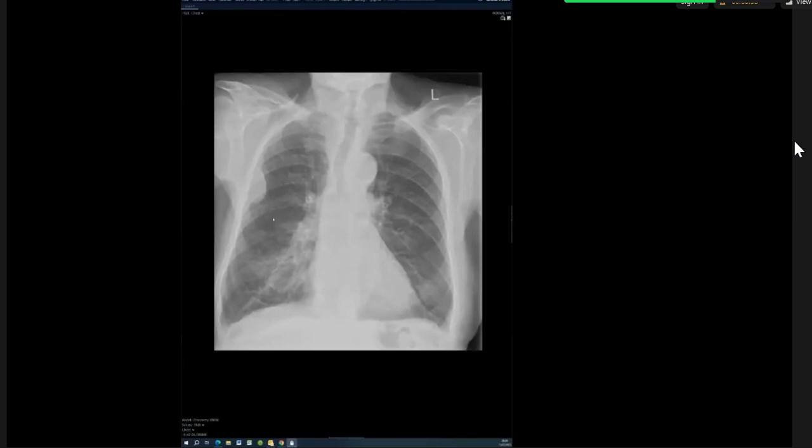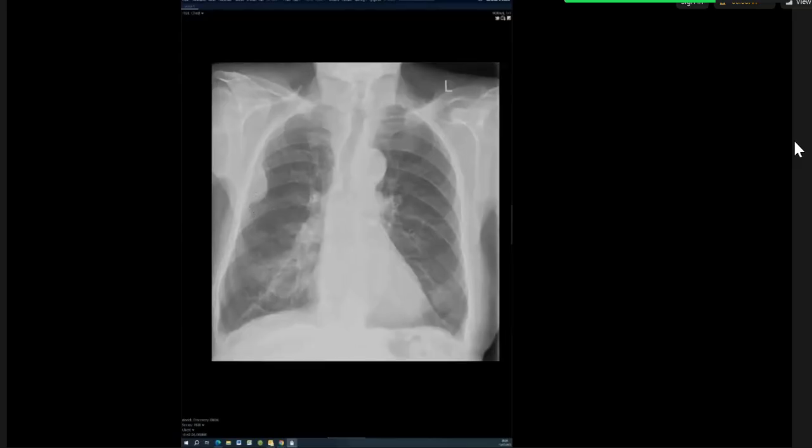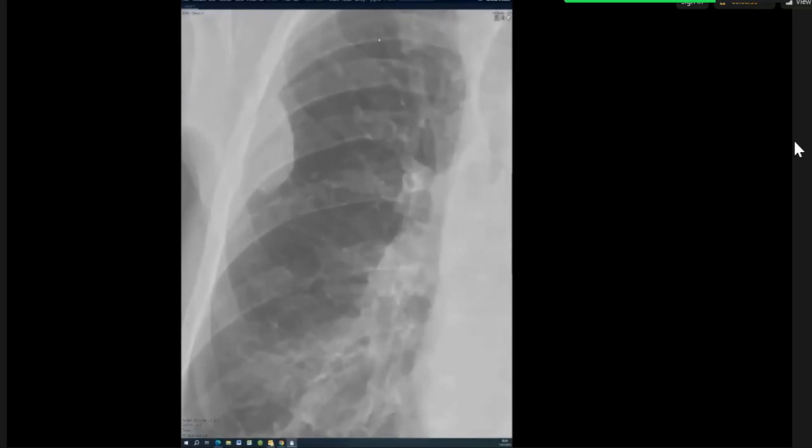So on the X-ray, one patient ago, what was the mistake you made? I immediately didn't recognize that the mass could have another differential, that it had obtuse margins. You didn't pick the bone destruction. Yeah, I didn't pick. Is there bone destruction here? Where is this rib? Yes. Okay, that one would have been a bit advanced.